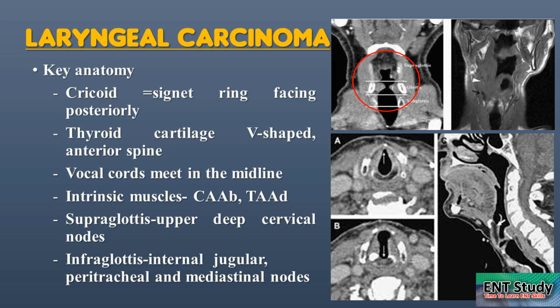You have to look at how clean the adjacent spaces are. Is the outline of the cartilage intact or not? If you look at the two spaces, you can see that. You can always compare, always keep comparing. Always keep comparing. That is the key to diagnosis.